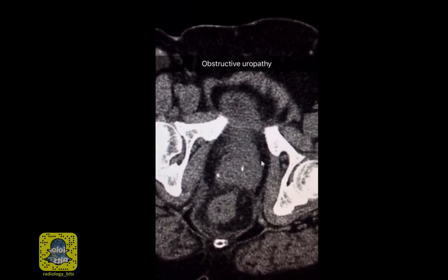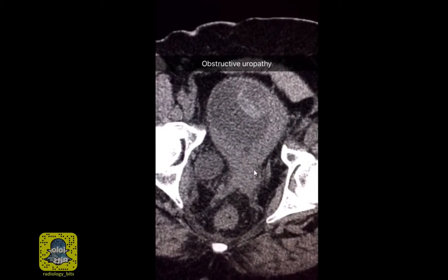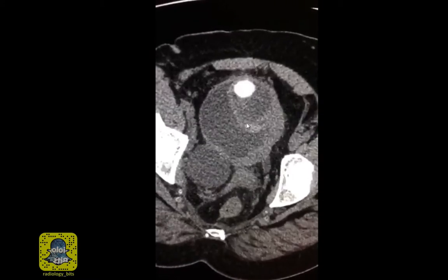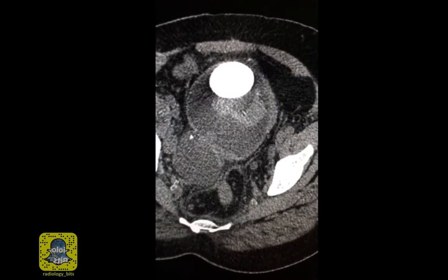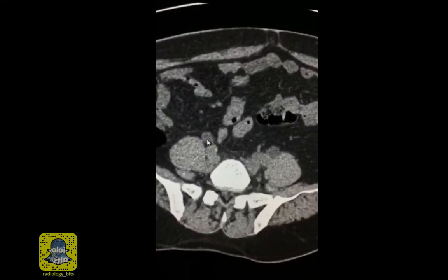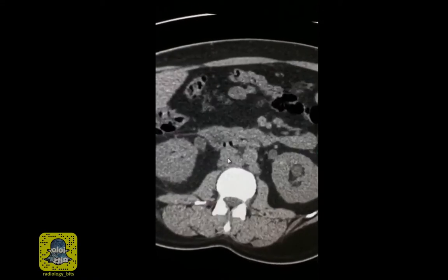Although you don't have an enlarged prostate, you have multiple features of obstructive uropathy. There is thickening of the urinary bladder wall that's involving the outlet, associated internal stone and adjacent hematoma, a secondary pulsion diverticulum due to chronic pressure and obstruction, and back pressure leading to bilateral hydroureter and hydronephrosis.